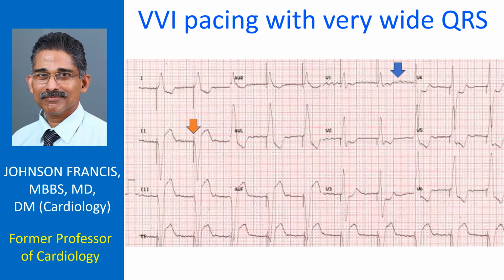The fact that the pacemaker has been implanted would suggest that there was an indication for pacing earlier. In this case, the patient had complete heart block earlier and a permanent pacemaker was implanted. Later, the person developed atrial fibrillation and the regular P waves usually seen with complete heart block were replaced by fibrillary waves. Left ventricular dysfunction and consequent atrial dilatation could account for the relatively coarse fibrillary waves.